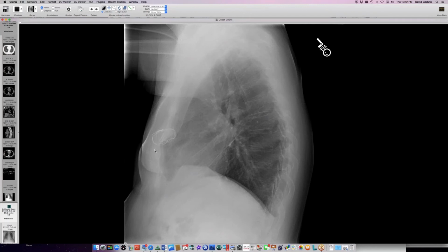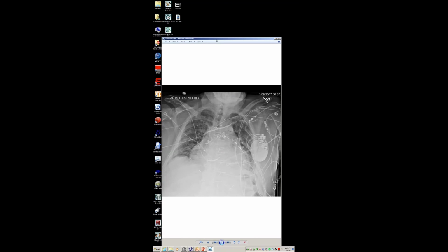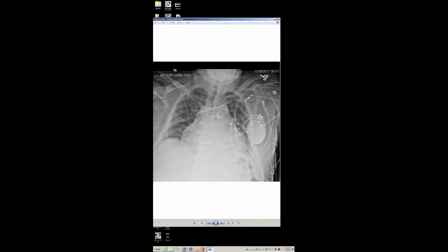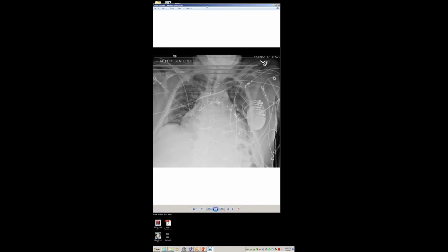Seth? Yeah, I can show mine real quick. Okay, so this is something I'd not seen before. Maybe you guys have seen it. I called this morning about this arterially placed subclavian catheter, saying you guys put it in the wrong place. But it actually turns out that this is a subclavian approach intra-aortic balloon pump. I had never seen one. I didn't know they made those.